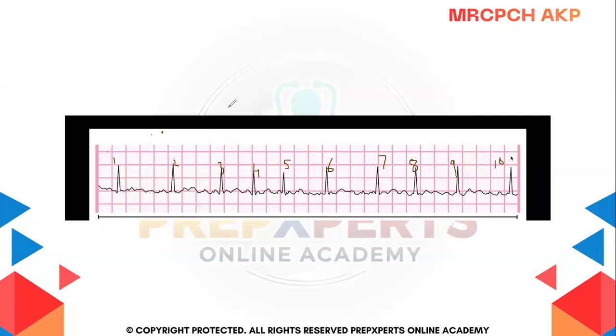okay, we have got new messages. Yes, these are 10 R waves. Dr. Zishan, you're right. Okay, now we get the heart rate, right? So we have to multiply it with 10 and we got the heart rate. That is fine. So you got the idea of the rate and rhythm. So I don't think it will be a problem for you to guess about the, okay, great.